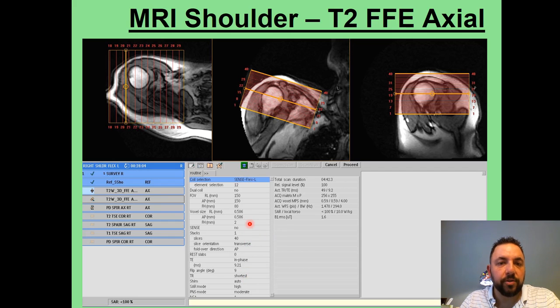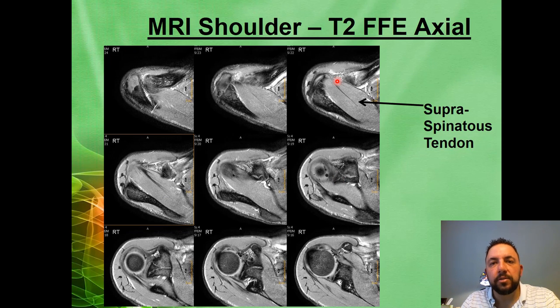This 3D application utilizes a 2 millimeter slice thickness, a 15 centimeter field of view, and 40 slices of total coverage in 4 minutes and 40 seconds, which is about average. Again, the supraspinatus tendon is going to be dark, and notice with the T2 gradient echo, the T2 star sequence, it's kind of nice for looking at the overall joint contrast, if you will.